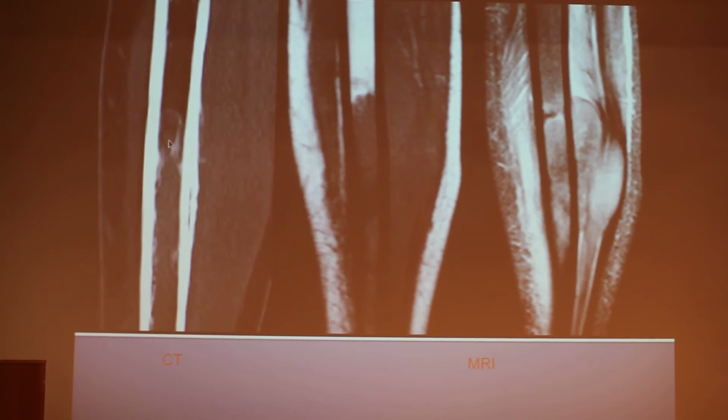You can now see an involvement of the medullary cavity that couldn't be seen on X-rays, and the corresponding MR here on T1 and T2, where there is no doubt. It's absolutely 100% malignant here on this lesion. And this was an Ewing sarcoma.